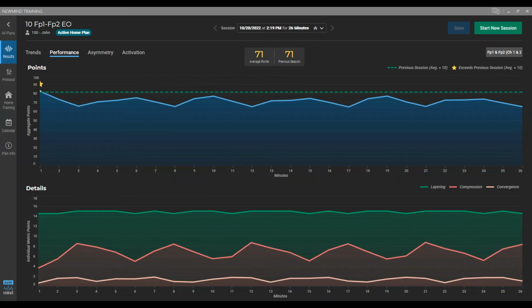I would want Richard to answer this for you as well, but my best sense from sessions I've run is that when the lines are close together and converging well, there's nothing unusual going on. Things are as they should be. If one side is elevated more than the other and the convergence isn't good, they could be thinking about something positive, negative, or emotionally upsetting. Sometimes when that happens, even the theta on that side does something different with the alpha.